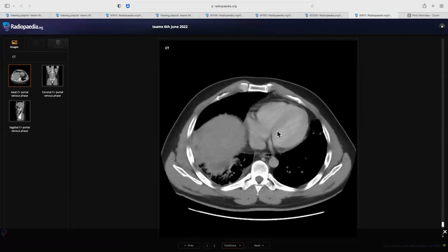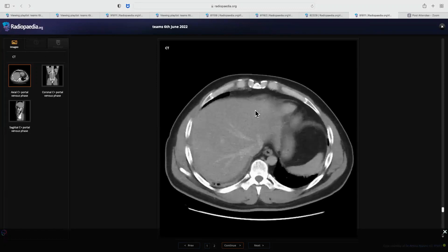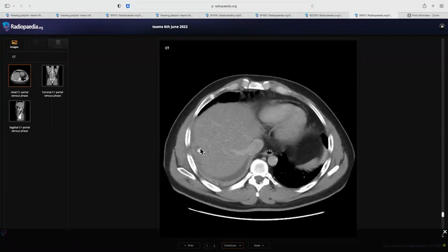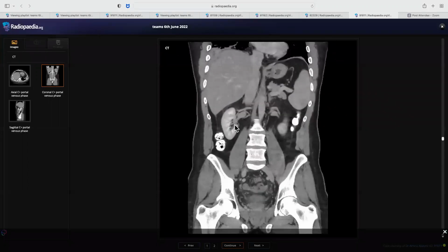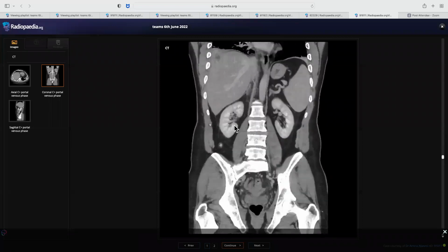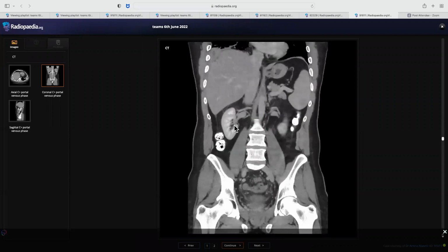So this is a case of appendicolith. Basically, it's a dropped appendicolith, or retained appendicolith, you can also say that. The patient had abdominal surgery 25 days back, as we already discussed. Because of that appendix surgery, the stone dropped and migrated superiorly and lodged in the subphrenic space. Thereafter the patient developed infection there, because of which there was fever and pain in that region. So you correctly said that this patient would need surgical management.